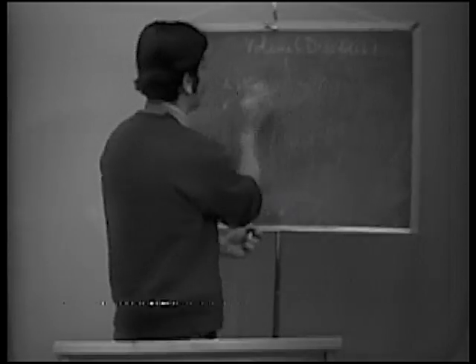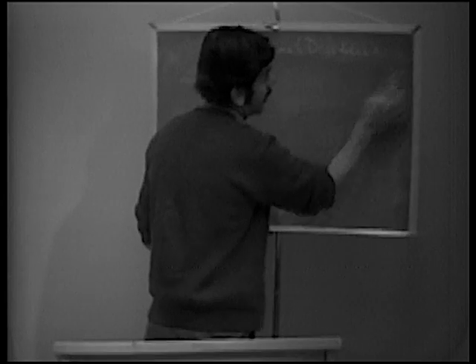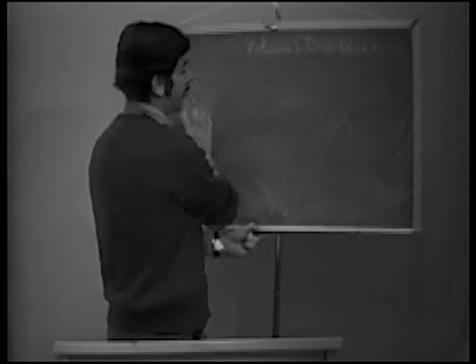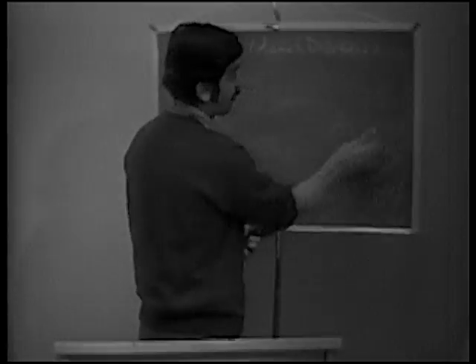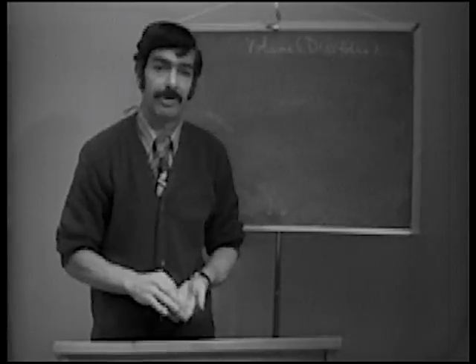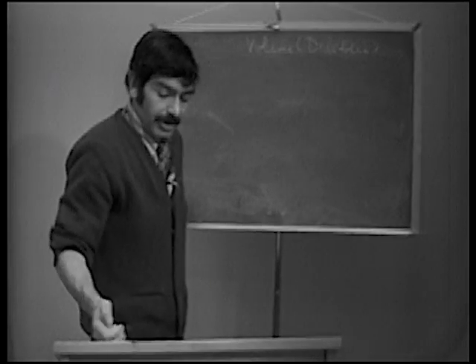Okay. Well, I don't want to belabor this point. This is not that commonly observed. It's not the usual bread and butter stuff that you see on the electrocardiogram, volume overloads. And the patterns and the criteria here, as you can see, are not very good and not very specific by any means.